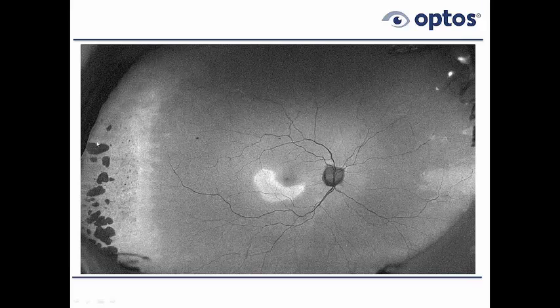In the periphery, in the far periphery, we have what could be paving stone. However, this is now sort of bordered with a zone of hyperautofluorescence, suggesting that this is really not paving stone. It's probably a peripheral retinal degeneration. It's really part of this retinitis pigmentosa. Again, RP more often than not starts in the mid-periphery, but there are a lot of atypical cases.